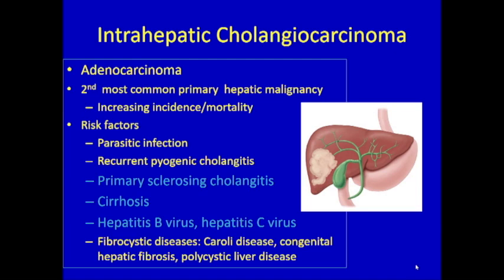And the reason I'm including it here is because these patients with cirrhosis, again, who we're seeing on our screening ultrasounds, are also at risk for cholangios, in addition to being at risk for HCCs. We know that ductal disease puts people at risk for cholangios as well as viral disease, but cirrhosis certainly should make you think it may not be an HCC. If you see dilated ducts in somebody who's at risk, think about cholangio too.